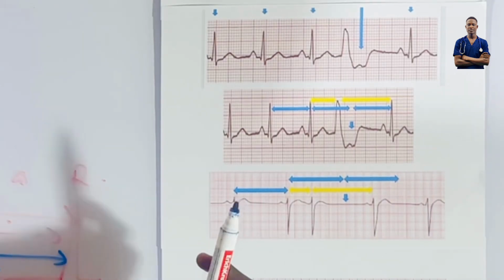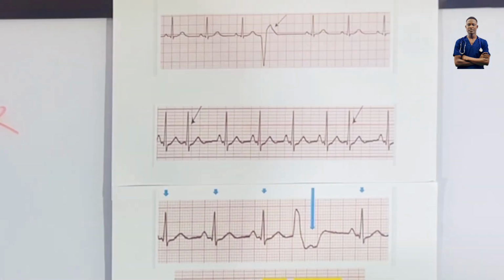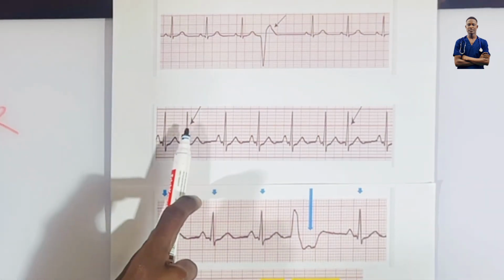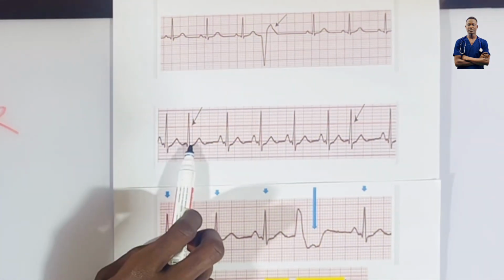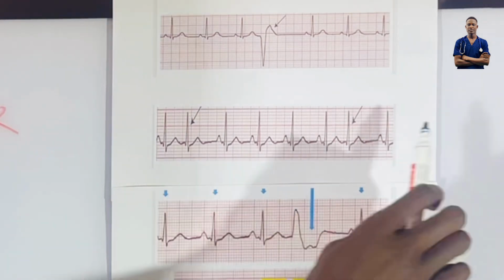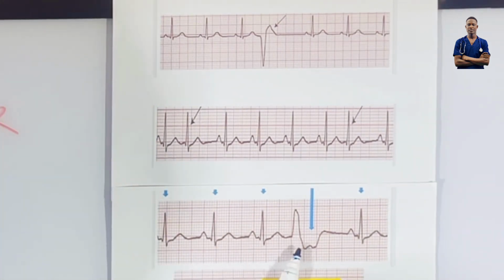Now let's look at a condition where the size or the structure of the QRS complex generated by the ventricle is the same as that of the sinus rhythm. Now let's look at this part. This where the arrow is our extrasystole. This is our extrasystole or our PVC. So our PVC over here is the same as the first one and the same as the rest. So with this, it's very difficult for you to identify, but this one is very easy.